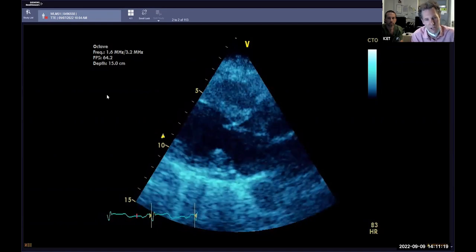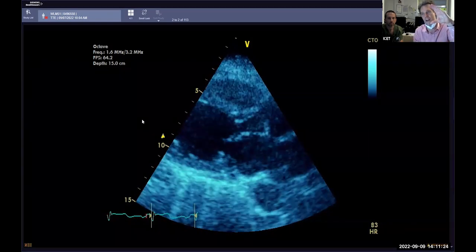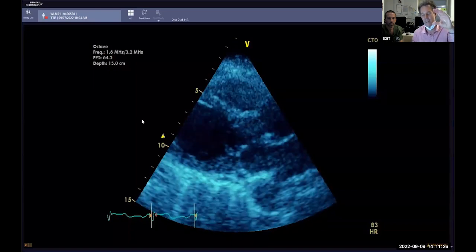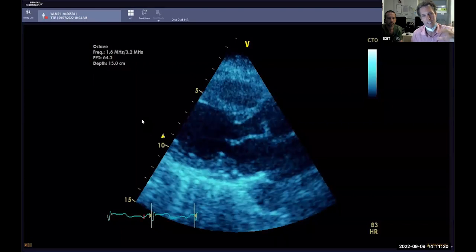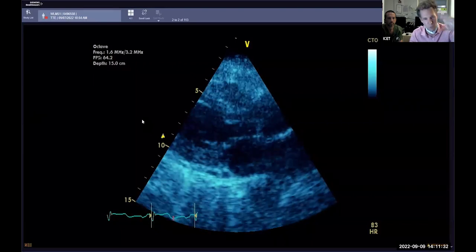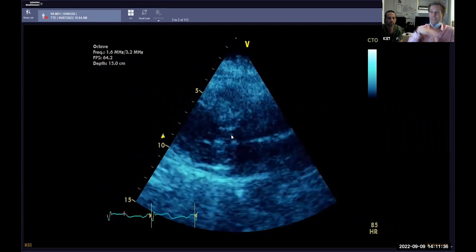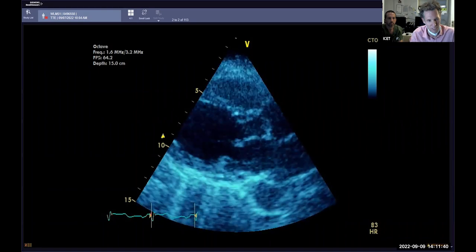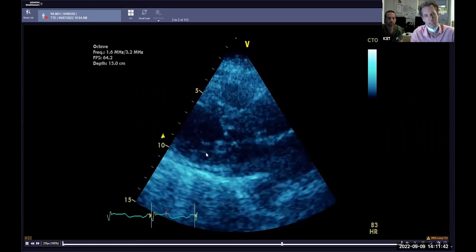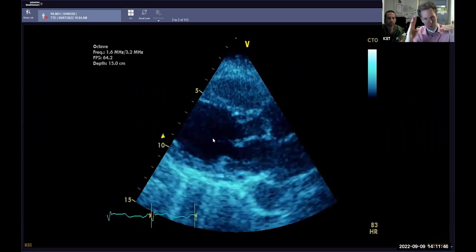So don't look directly at the LVOT, but look in here to try and get an idea of when the ventricle is squeezing. And when the ventricle is squeezing, that's systole, right? So if I know when the ventricle's squeezing, I then use the peripheral vision to see if the valve comes into the LVOT during that section. And now I'm going to slow it down. It's always easier looking at it in slow form. So squeezing and pulling in, squeezing and pulling in.